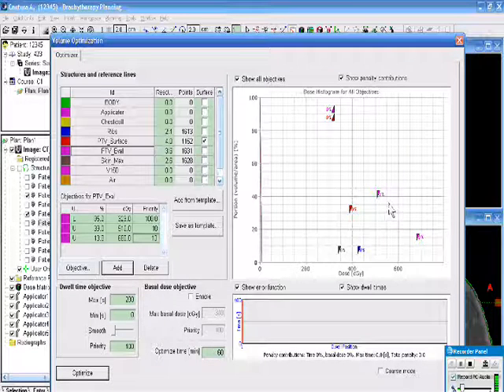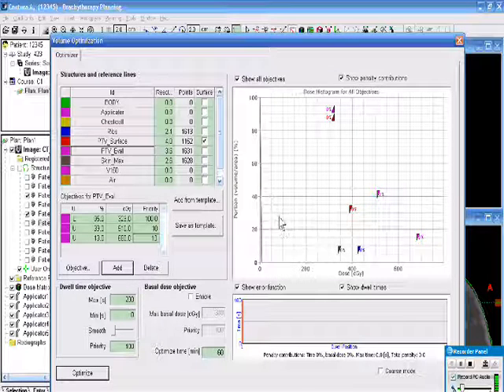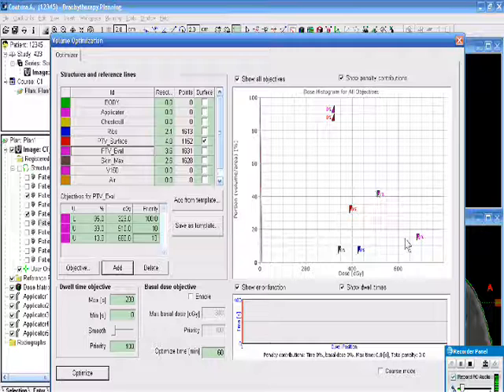In general, I don't like to move these markers around on the skin while I'm optimizing, but just to change the priorities. The one exception to that is this V150 marker. We don't have it set at the B39 definition anyhow, and if we push it down a little bit, we'll get a little bit more sparing of V200 as well.